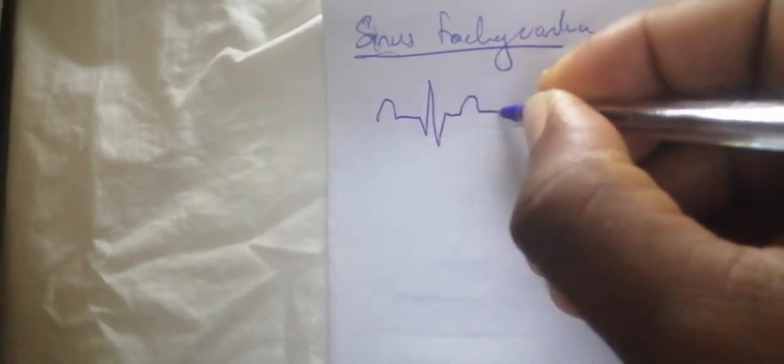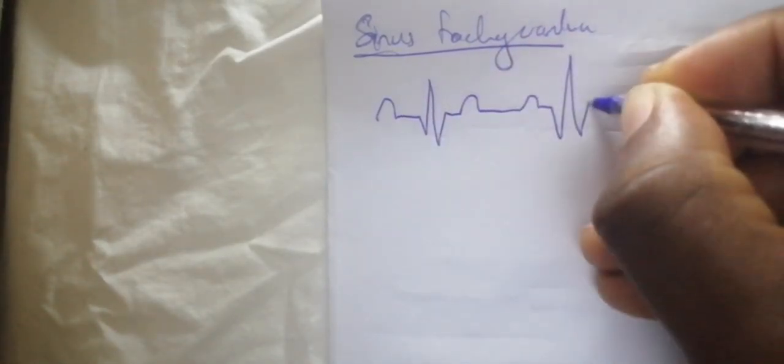For the ECG interpretation of supraventricular arrhythmias, this will be the sinus tachycardia. Generally, how does sinus tachycardia present? You have a patient that has a sinus rhythm, is it clear? But the heart rate is going to be elevated. If you have a patient that has a sinus rhythm and you measure the heart rate, it is more than 100 beats per minute. By using any of your rules, that is going to be sinus tachycardia. That is how you make a diagnosis of sinus tachycardia.